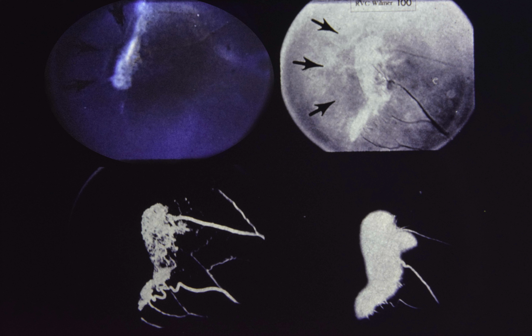Here are your questions. 1. Describe the morphologic features on the fluorescein angiogram. 2. What diagnoses ought to be considered? 3. What studies would you request to establish the diagnosis? 4. How would you manage this patient? Now return to slide 95 and we will review the findings and answer the questions.